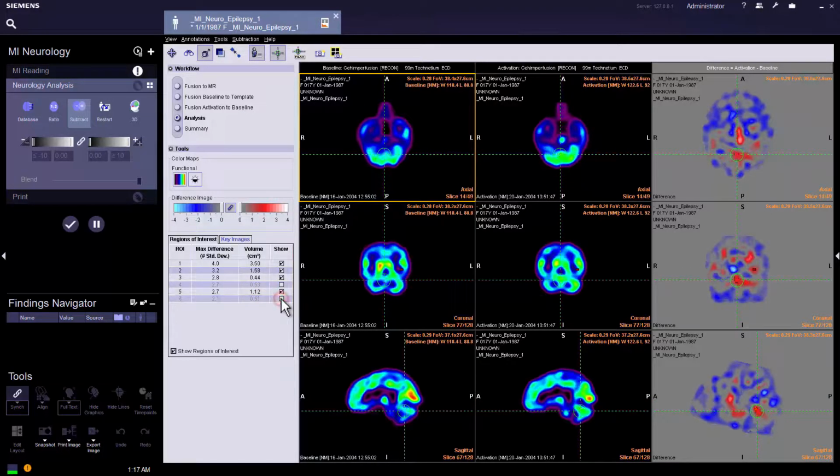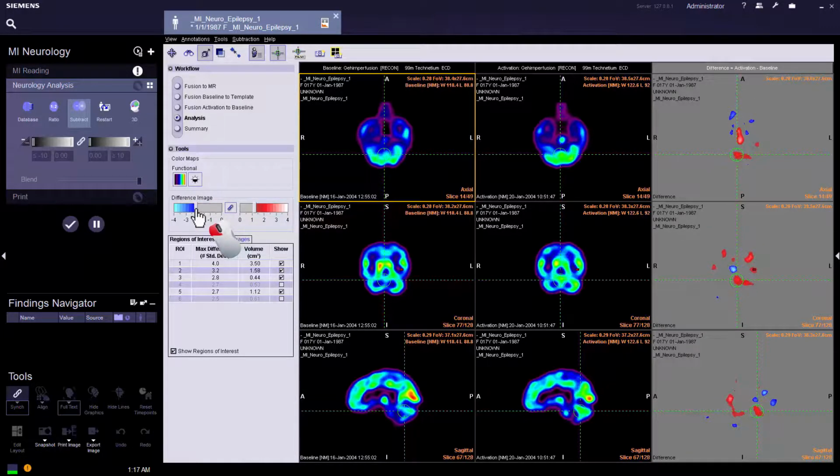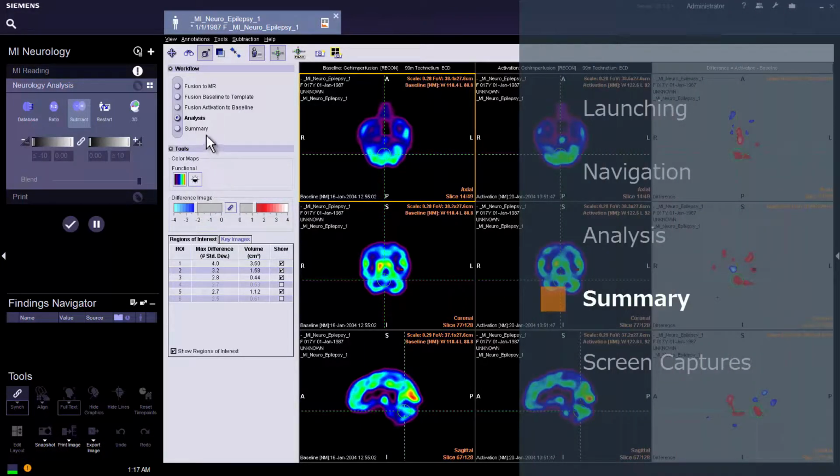The Difference Image Masking tool allows the capability to hide or show positive or negative differences and define standard deviations to start showing images. Left-click on the slider to move to the left or right. The slider can be unsynced by left-clicking on the icon. The positive and negative information can be modified independently.